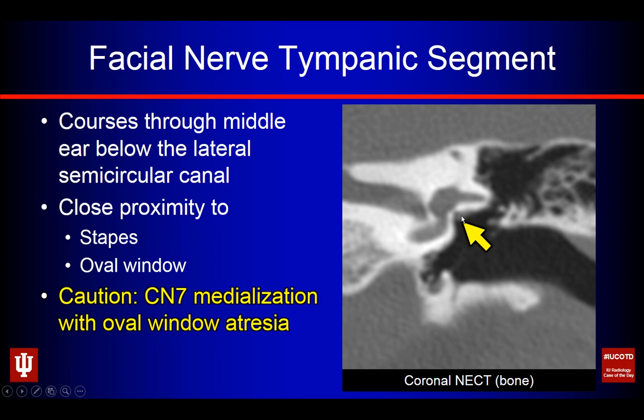Let the surgeons know whether or not that is sitting inferomedially overlying the atresia plate, because what you don't want to do is send the patient off to surgery risking iatrogenic injury. They may still perform the surgery, but you want to let the surgeons know ahead of time about that risky anatomic structure.